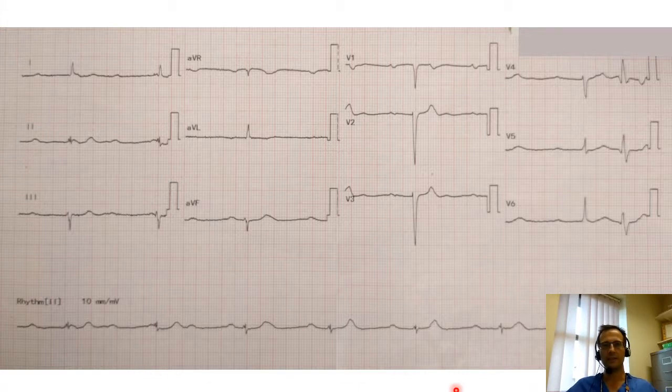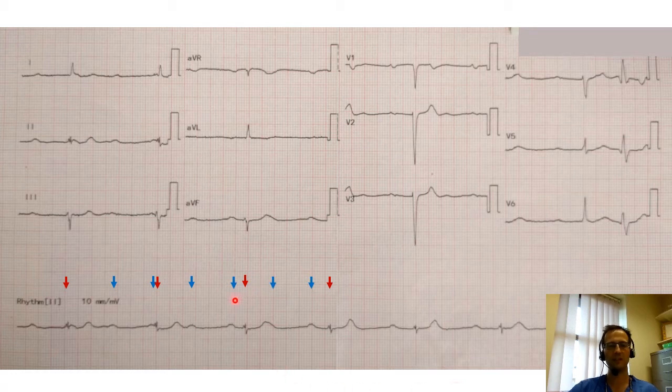What about this ECG? So look at the P waves. In fact, I'm marking the QRSs first. Look at the QRSs, and they're regular. And look at the P waves and map them out along the ECG. And can you see that the P waves don't line up, don't have any relationship with the QRSs? There's unphysiologically short PR intervals in some places, and there's P waves forming parts of the T wave in other places. So no relationship. This AV dissociation tells us this is complete heart block.